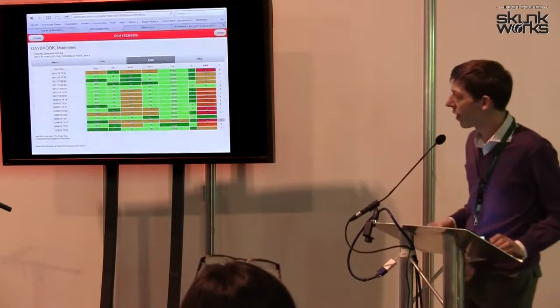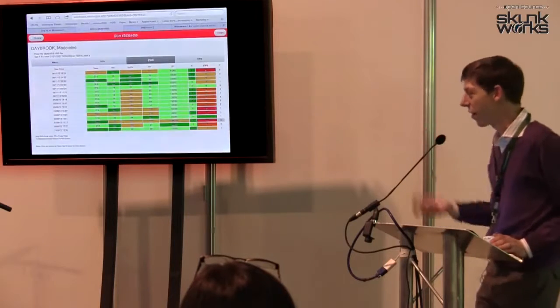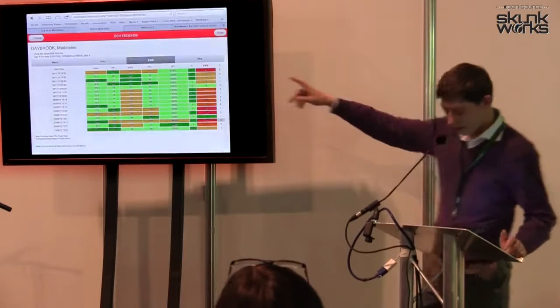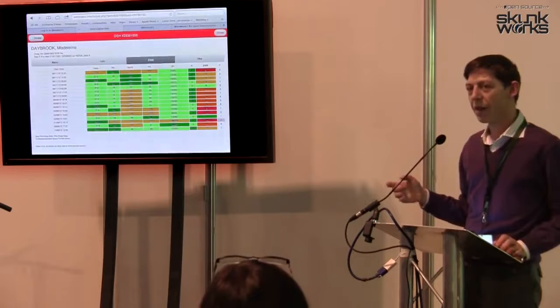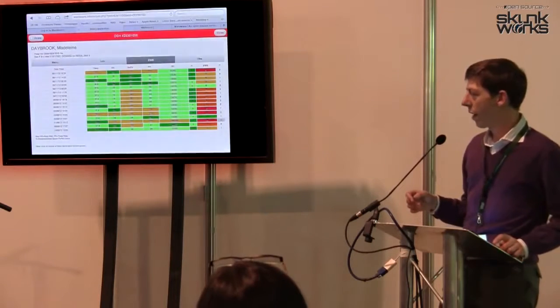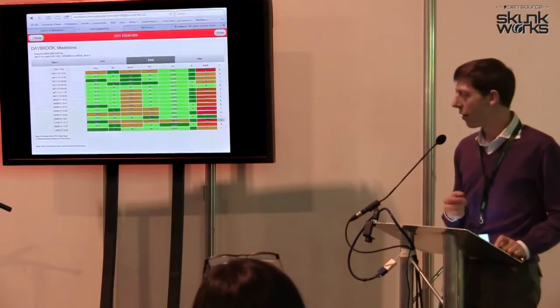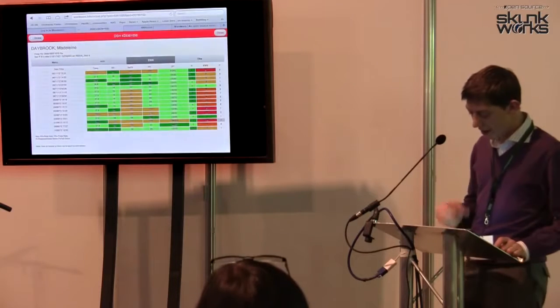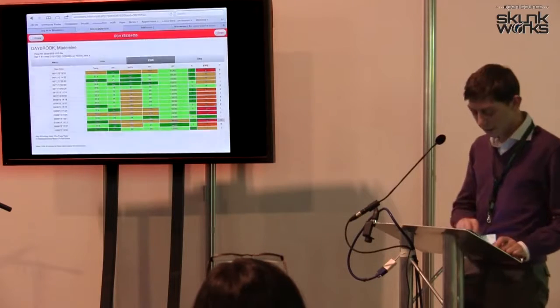We can see that here, tabulated data, quite easily color-coded. When you've got it in your hand, of course, it's a bit easier, it's right up close. If anyone needs to put their glasses on, they can do that. But as you can see along the screen there, we've got the EWS 8 at the top. We're following the colour scheme that the Royal College of Nursing and the Royal College of Physicians have been advocating for their campaign recently about doing the EWS much more systematically in the trusts. And the algorithm behind it is actually at the moment using the National Early Warning Score algorithm.